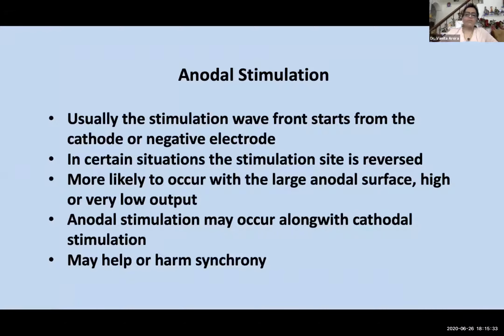Most of the time, the LV lead has been programmed in the pseudo bipolar mode that we call it. So here the threshold of the LV will be okay, but V1, the lead 1 will be positive. So what we can do here is to switch the LV lead into a true bipolar, rather than pacing between the LV lead as the cathode and RV as the anode.